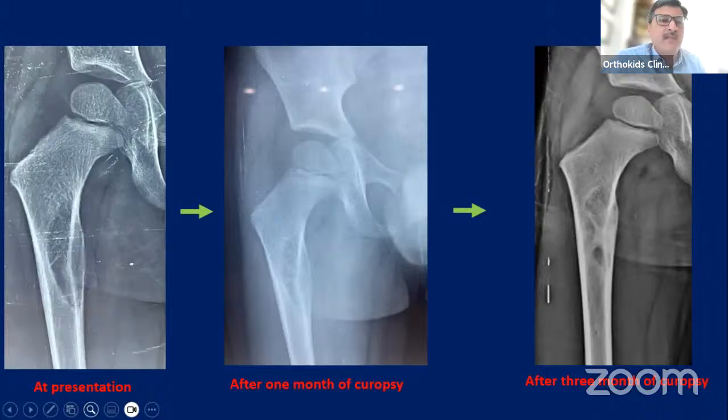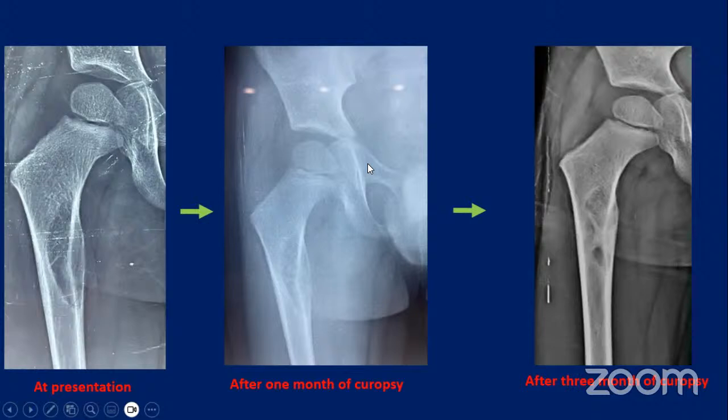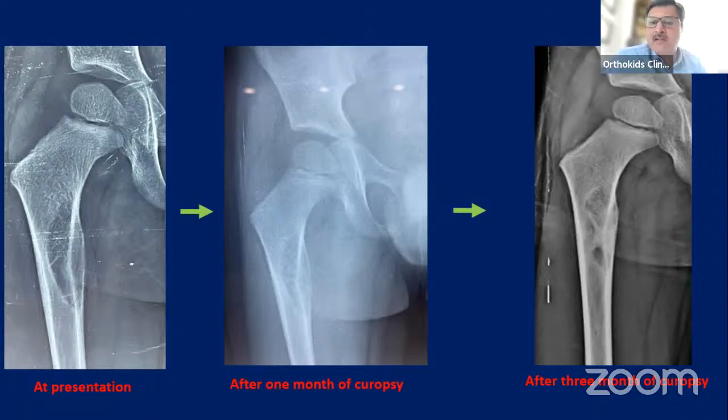And that's what happened, Mandip. We just got this X-ray yesterday. Right. And the patient is better. And mother said now he's playing cricket and he's asymptomatic. Absolutely. So I think your assumption was right. And this is a healing lesion. And we'll still be following this child.